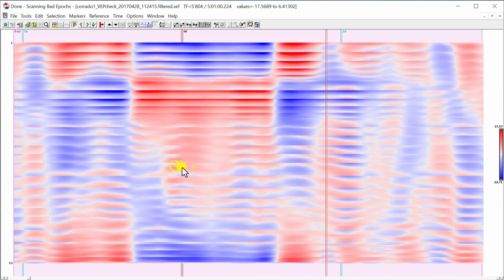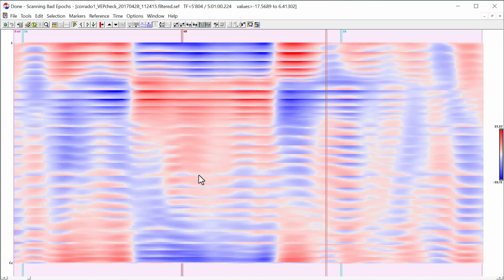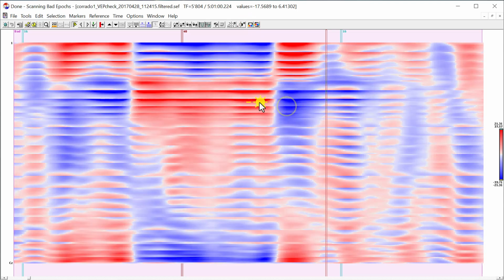Note that you can temporarily bypass the auto-scaling by changing the brightness with the mouse. Upon releasing the mouse, the auto-scaling will kick back. Finally, one more press will revert to the manual brightness mode.